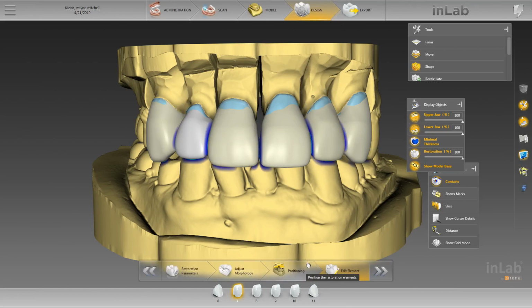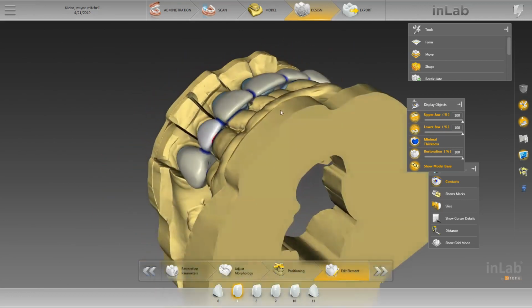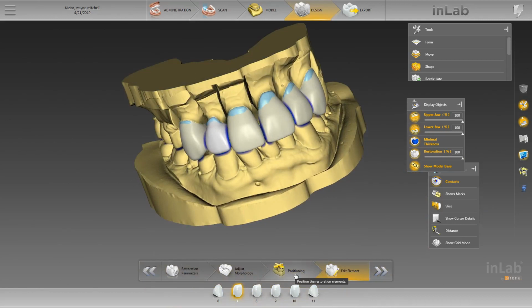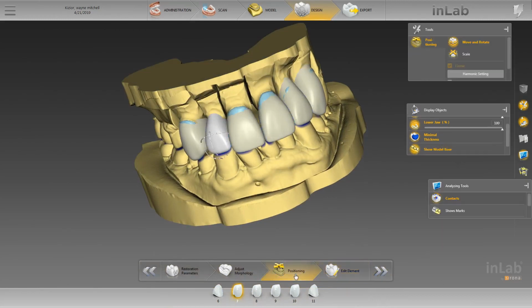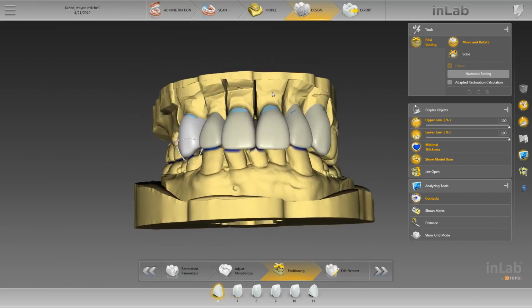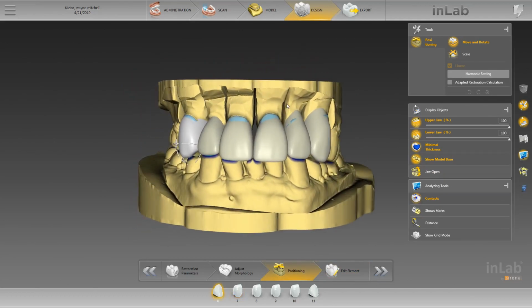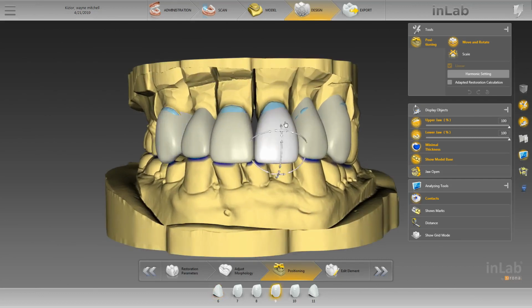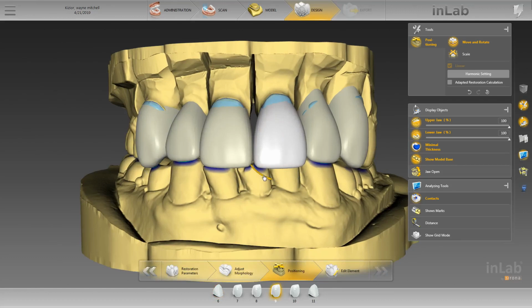Okay, so honestly, our proposals aren't too bad. It's a lot better than I expected, but I did skip a couple of steps in the positioning phase, so we're going to go back. And after seeing the proposals, I've also noticed some things I'd like to modify. So for number 9, it looks like it's coming in a little bit angled, so we'll turn this just slightly, just rotate it, bring it out a little bit more that direction.